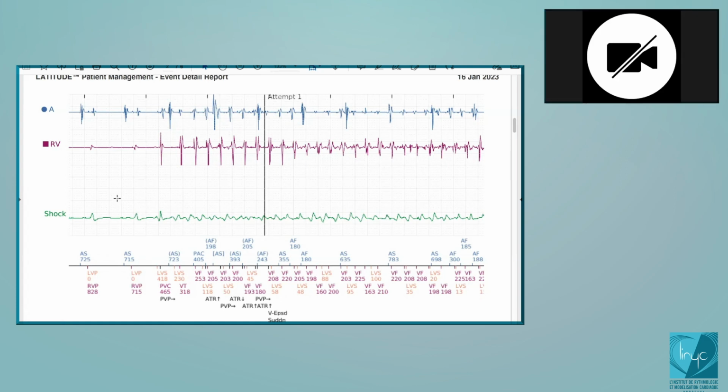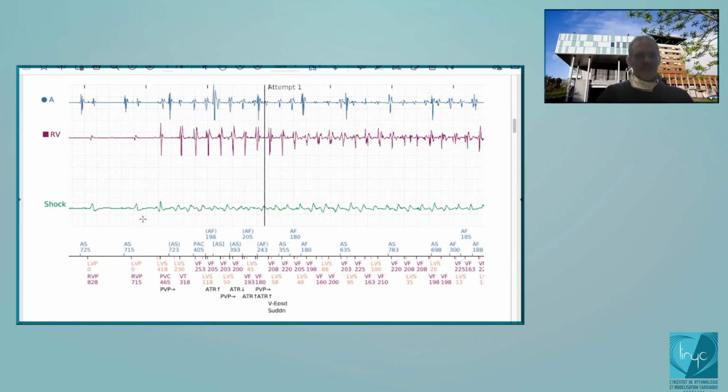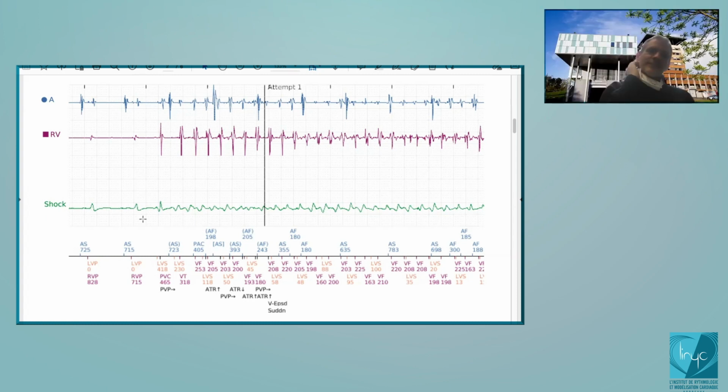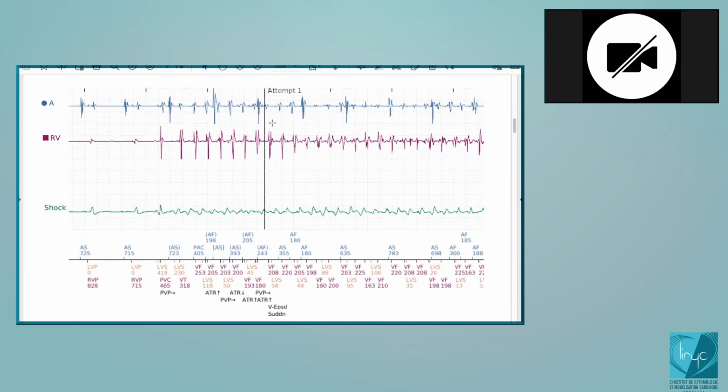So we have a spontaneous atrial signal, then left ventricle and right ventricle pacing. Yes. Then we have the beginning of a tachycardia with a spontaneous premature contraction, followed by another one. Yes. After three, it's the beginning of the tachycardia in Boston programming. After three fast cycles in the VT zone.